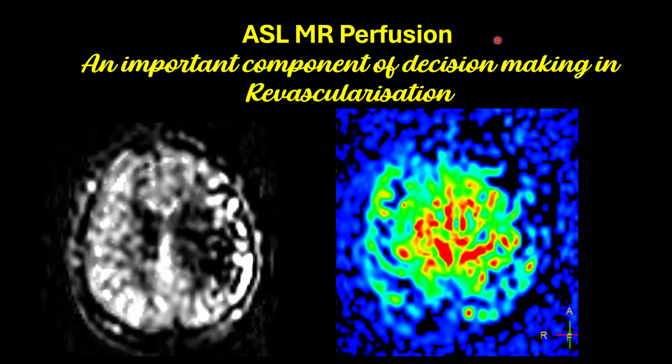This is a very important technique because we use endogenous contrast. We don't administer contrast from outside. This is an endogenous contrast, and we identify whether there is a penumbra tissue which is present in the patient. Here we are able to see that there is a large blackish area. So for the infarct which was here, the penumbra tissue is nearly the left MCA territory.